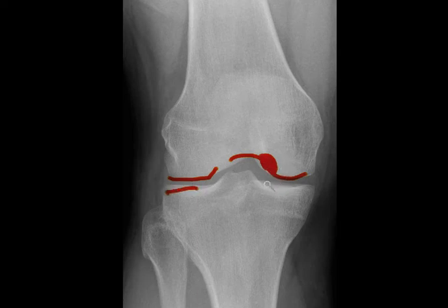The tibial plateaus are intact, but to look for subtle tibial plateau fractures, drop vertical lines down from the borders of the femoral condyles and see what the relationship of the tibia is to these lines. The tibial condyles should lie within these lines or project just outside. If they are projecting well outside, more than 5 millimeters, then suspect a tibial plateau fracture.